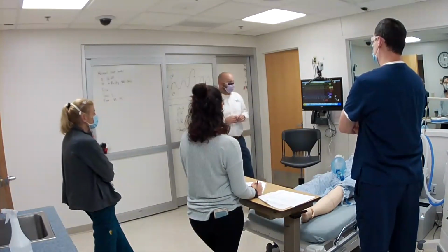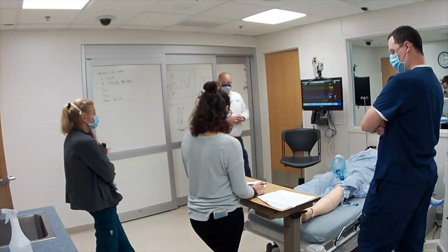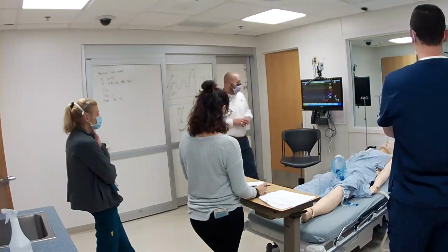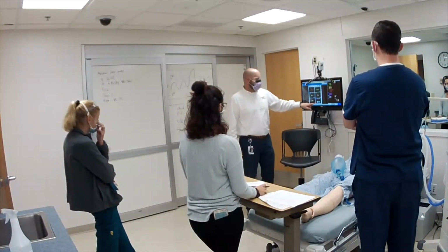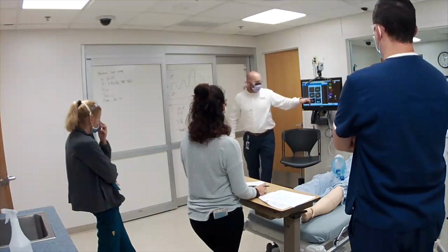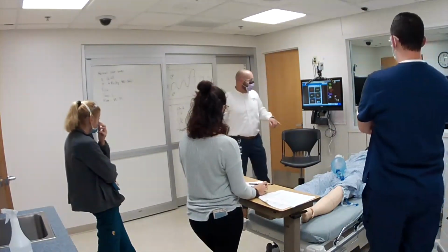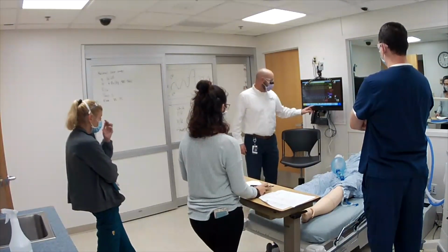Discuss the lung volumes observed on the physiology. Oh, yeah. So here are his lung volumes. And what we're seeing here is this amount, this static amount at the end of the graph. Okay. Observe the cardiac output reading. So we got that. We're not going to spend time on that. We just did that one. Yep. So we got cardiac output there. Looking good.